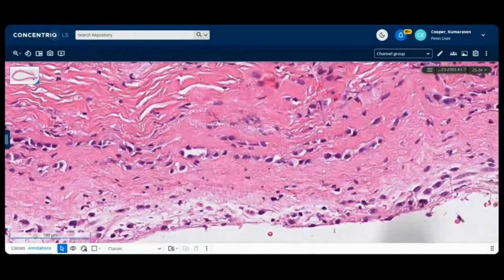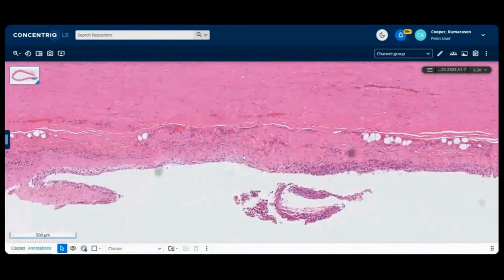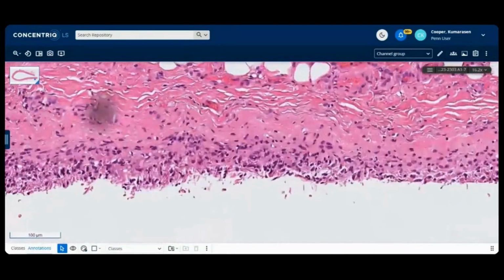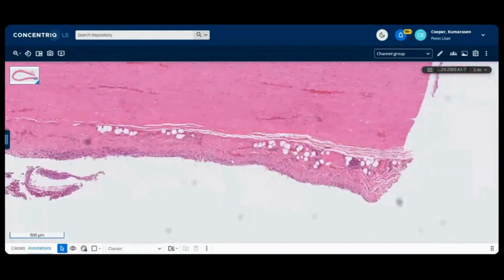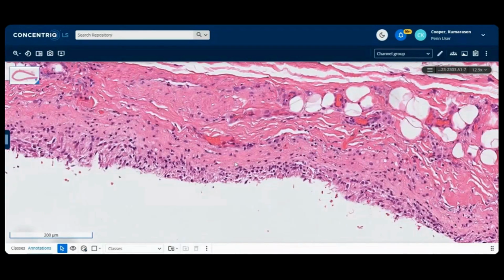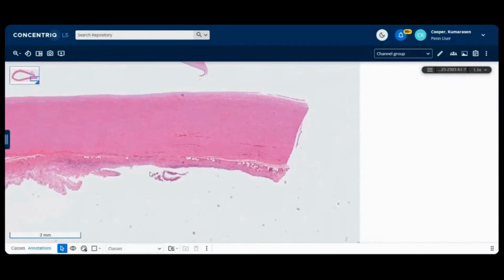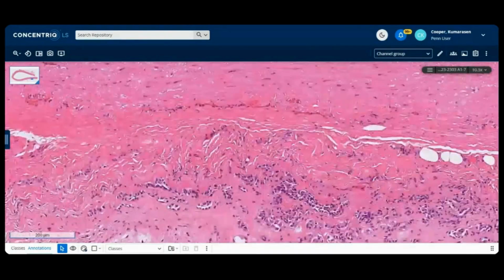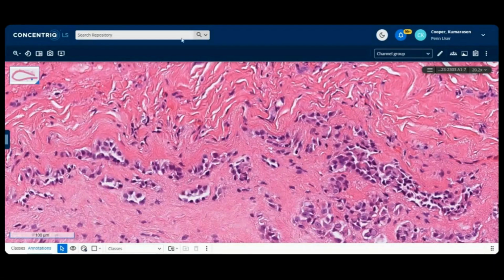All right, there you go, trickling along. Right, low power, very hard to see, but as we go down, you can see more and more of them here. There we go. You can see these cells here. Okay, that's pretty much it. So nothing about the aorta, except the adventitia, which has this sort of bland-looking proliferation of epithelioid pink cells.